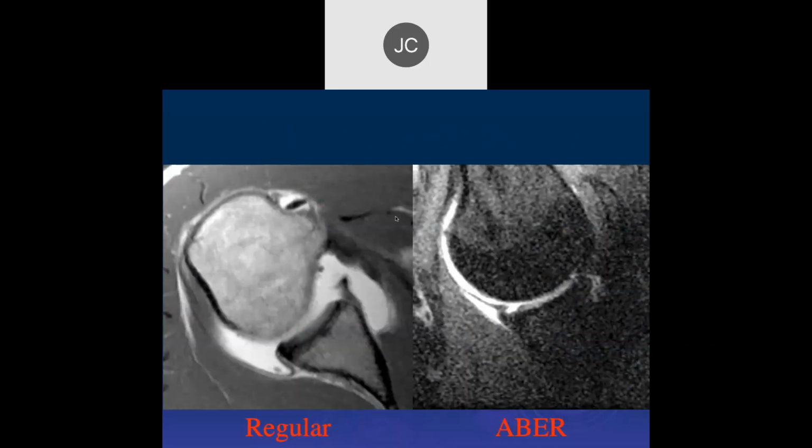Okay, Tayson. All right, so we're looking at the anterior inferior glenoid and labrum, which looks like, is there some stripping of the periosteum there? Well, what do you see here? That looks like displaced labrum. Okay, so this is a labral tear. Yeah. Maybe there's a little thickening of that periosteal attachment.